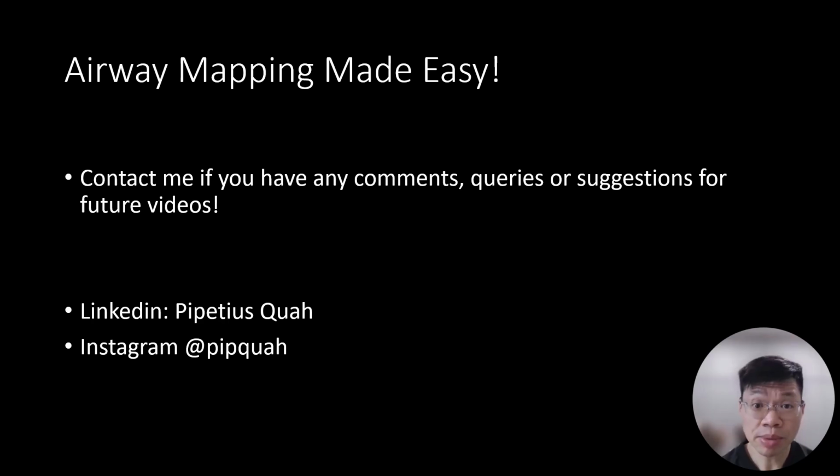Thank you very much for joining me on today's tutorial, and I hope it clarifies how you can use multiple CT views to help you draw more complex branching patterns.